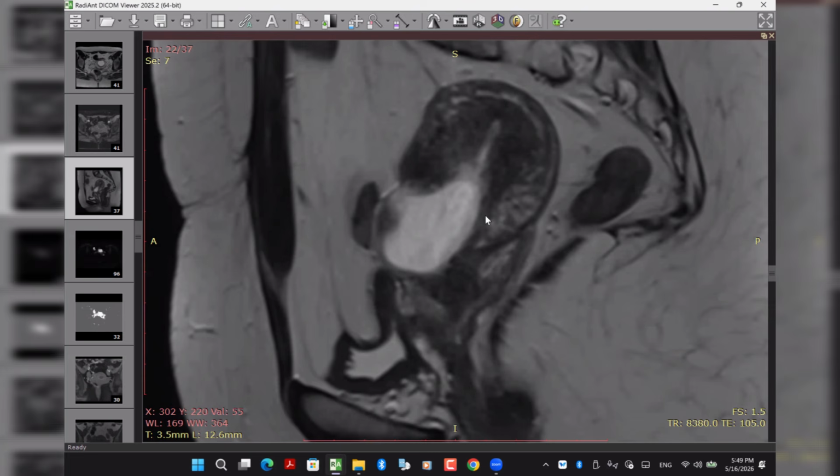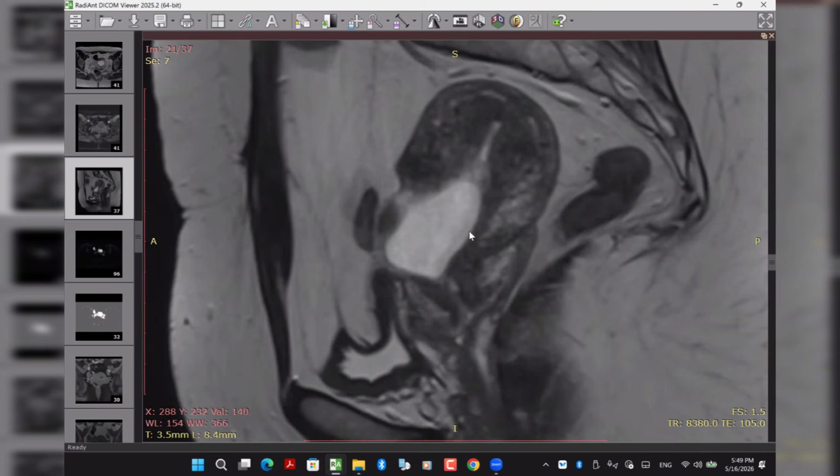I would like to correlate it first with the beta hCG levels of the patient. Yes, excellent. You are totally amazing. If it is high. So this patient has a positive pregnancy test. What do you think? Then it's an ectopic pregnancy within a previous cesarean section scar. Yes, you did it very well.